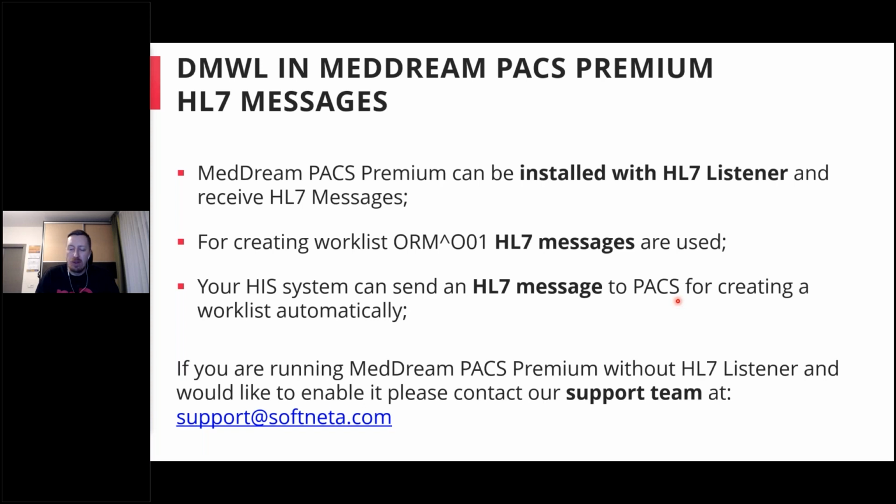When you install PACS Premium, if you download it and do a fresh installation, maybe you have noticed that one of the last installation steps allows you to check a setting to install the HL7 listener. If you check it, it will install the HL7 listener, and it will enable PACS Premium to accept HL7 messages and store them in the database.